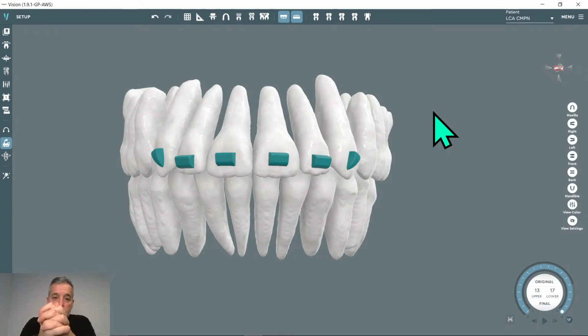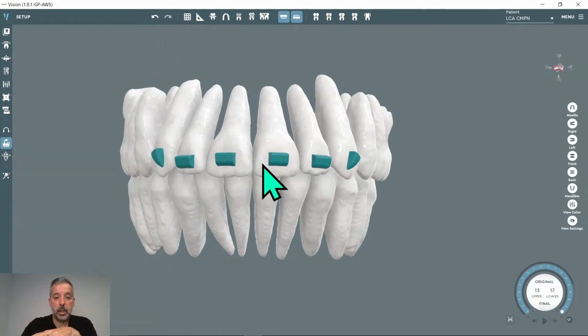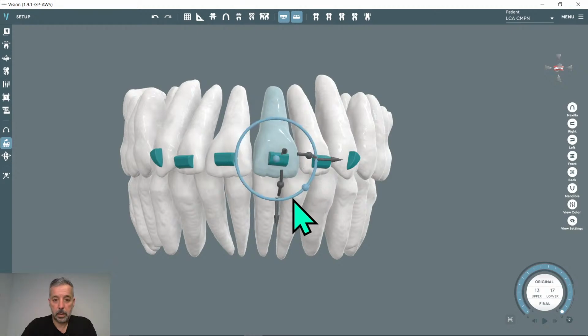The clinician has two options: just the viewer, just to see everything in 3D, the amount of movement like in the corner here, type of attachment, collision and everything, or the DFA. DFA means the doctor has the possibility to manage the setup, change teeth, but not modify the treatment plan. Just change the position of the teeth and save and send back to you.